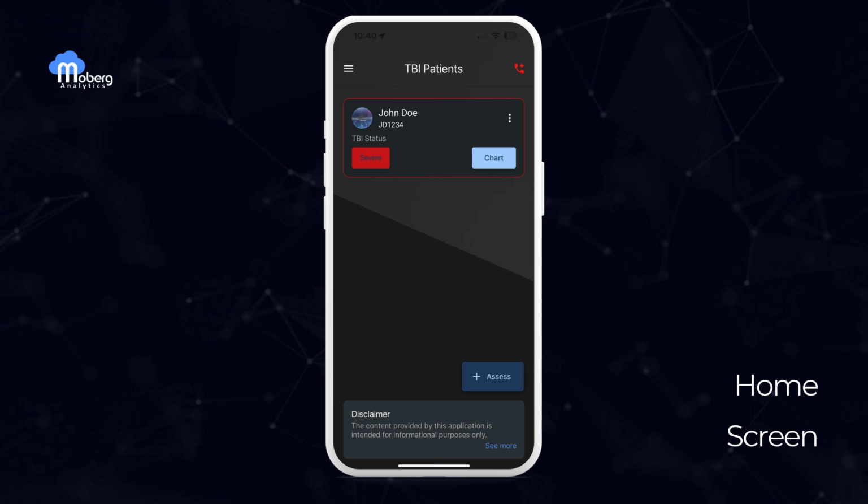We're now back on the home screen, where you can see a list of all the patients you've added. Since we just completed an assessment, you'll see a new patient card displayed here. Each patient card provides key information at a glance, including the TBI status. On the card, there are 3 dots that open up a quick action menu with options to edit the patient, copy the patient ID, or delete the patient record entirely. There's also a chart icon that will take you directly to the chart page for that patient.